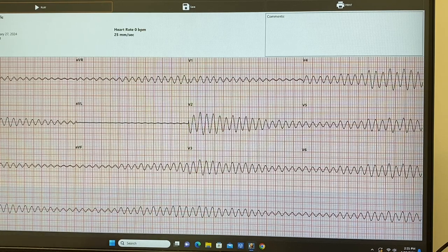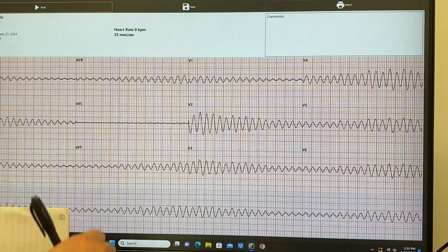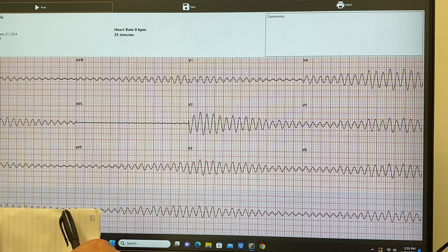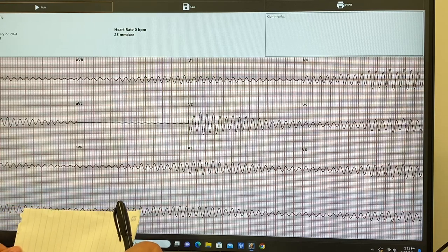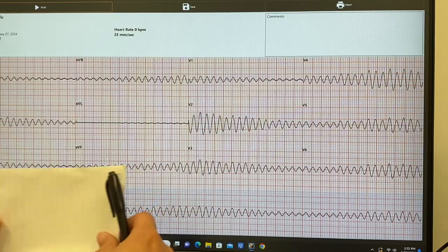Or, actually, no. Let me check. Okay, so our rhythm is regular.